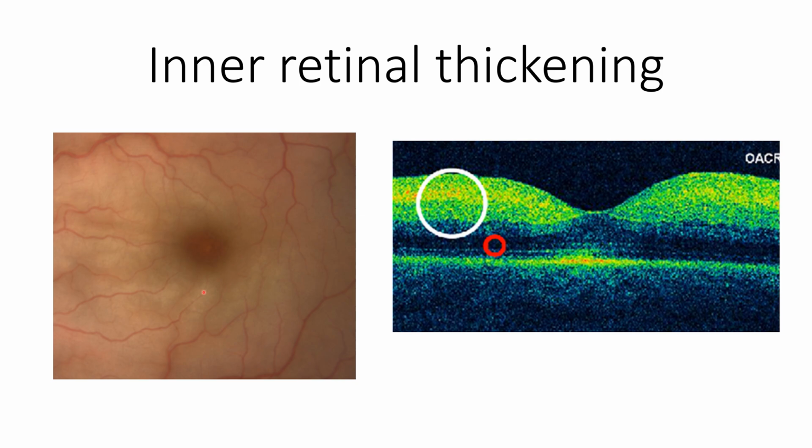Although the abnormality lies in this particular area, which is ischemic, hypoxic, and opaque. And when we do an OCT, we'll find that these retinal layers, the inner side, have become thickened and opaque, and they no longer allow visualization of underlying layers. So this is inner retinal thickening. The inside portion or inner layers of the retina are thickened and edematous, opaque, secondary to a central retinal artery obstruction.